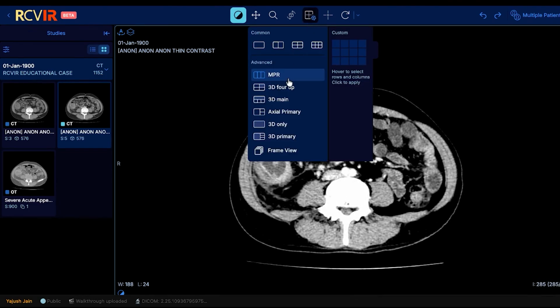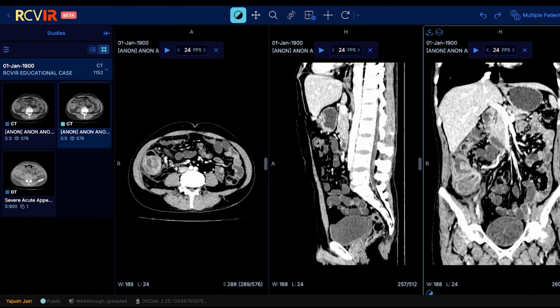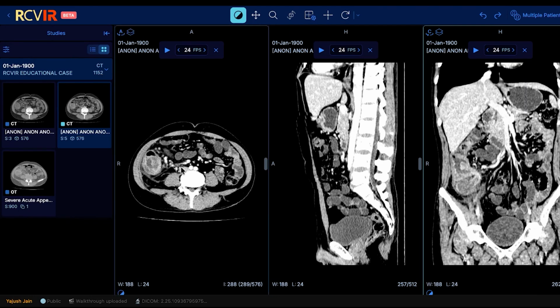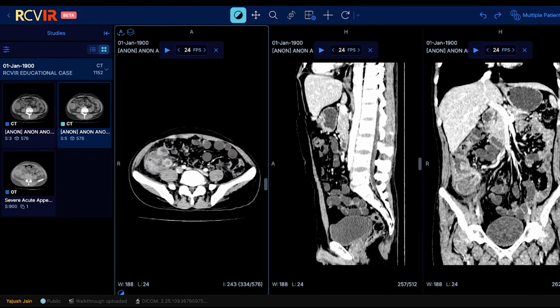So, one more thing we would like to add here is that while some people, especially the young students, prefer to look in the coronal or the sagittal sections as it helps them to pick up the diagnosis very fast, remember, in cases like this, one might confuse the appendix as a part of the cecum itself.